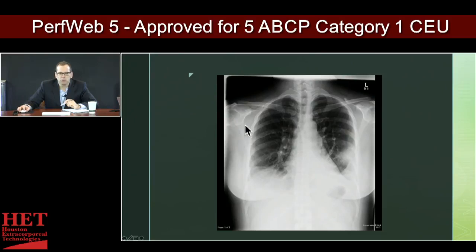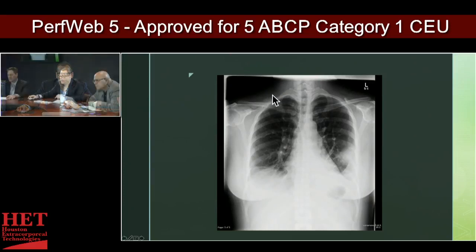If you see a lot of subcutaneous emphysema, then of course in your thought process you could think, well, maybe this patient's developing bad pulmonary contusions and that's the reason for the VV ECMO. You can look up into the neck if you've just placed a line and you can see if the line's in the exact place, if it's heading down the normal vasculature. Can anybody here discern some of the subtle defects that are in this x-ray?